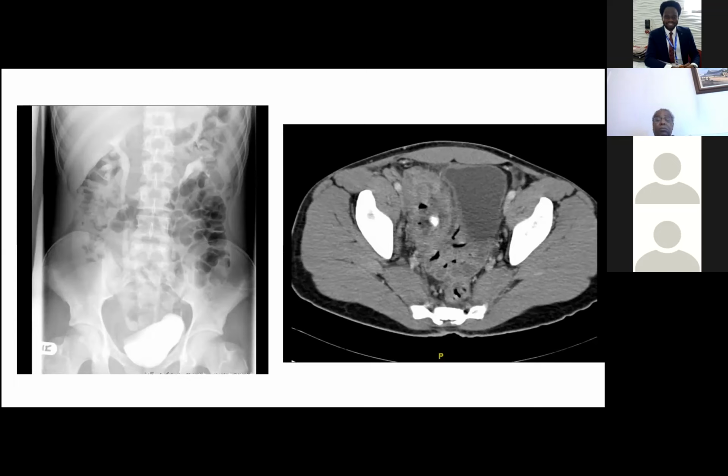Yeah, good. This IVU was performed roughly 15 minutes after injection of the X-ray dye, and what you can see when you compare right and left is mild fullness of that right collecting system. And as you've correctly pointed out, the bladder appears to be shifted over to the left side.